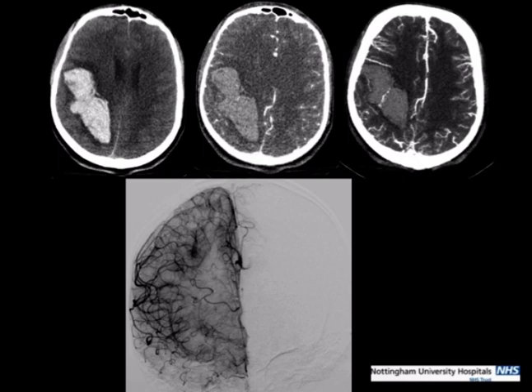So I think these are really helpful to make abnormal vessels stand out. This is just a 1 millimeter thick MIP from the CT angiogram that shows this abnormal vessel crossing the hematoma, which was confirmed as a micro AVM on follow-up catheter angiography.